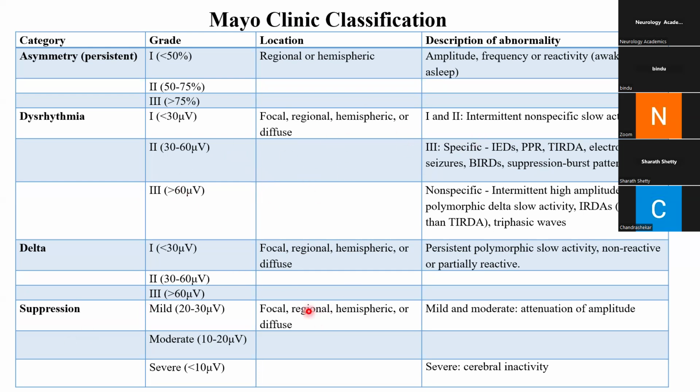Delta I already described, and out of the delta, temporal intermittent rhythmic delta activity, which should be monomorphic and confined to the temporal region. Neena has proved that by introducing electrodes into the hippocampus and the amygdala, when temporal intermittent rhythmic delta activity was occurring in the scalp, it was occurring inside the brain as well. So that is why we qualify it as temporal intermittent rhythmic.